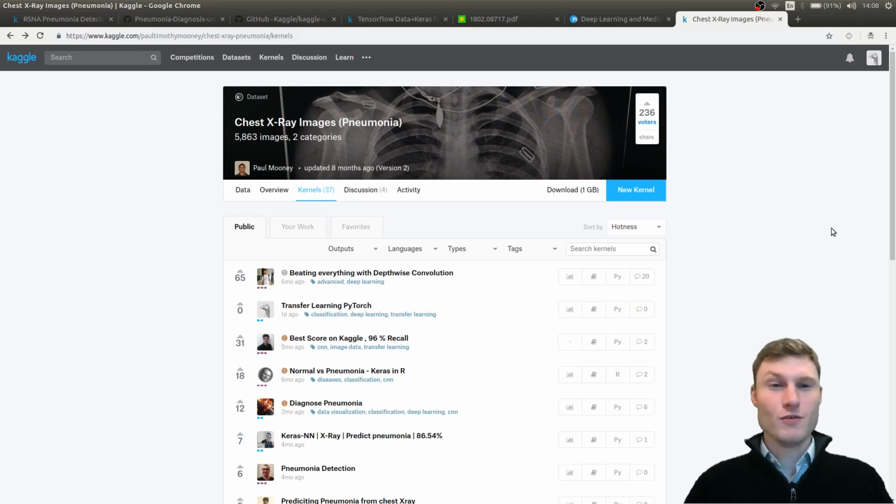Welcome to this video. In this video I'm going to show you a very simple application of deep learning in radiology. We're going to look at chest x-ray images, some of them diagnosed with pneumonia and some with the absence of pneumonia. So there's two classes. We're going to look at two pretty simple classification models in Keras.